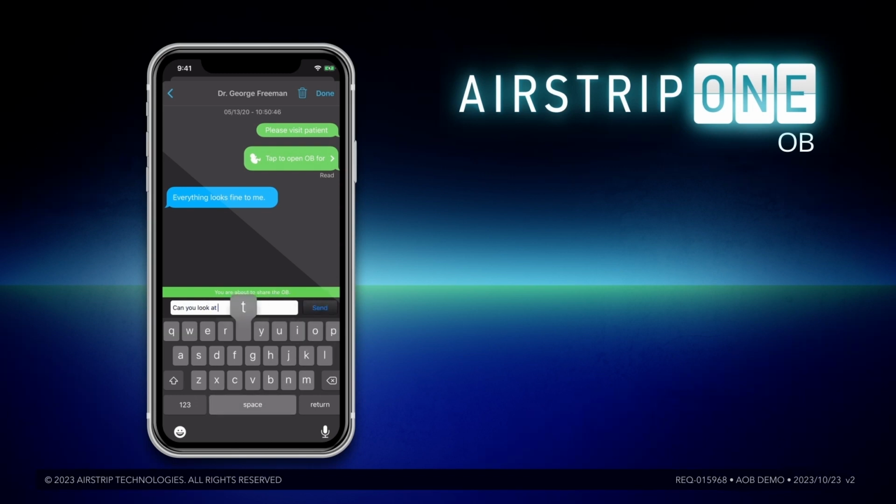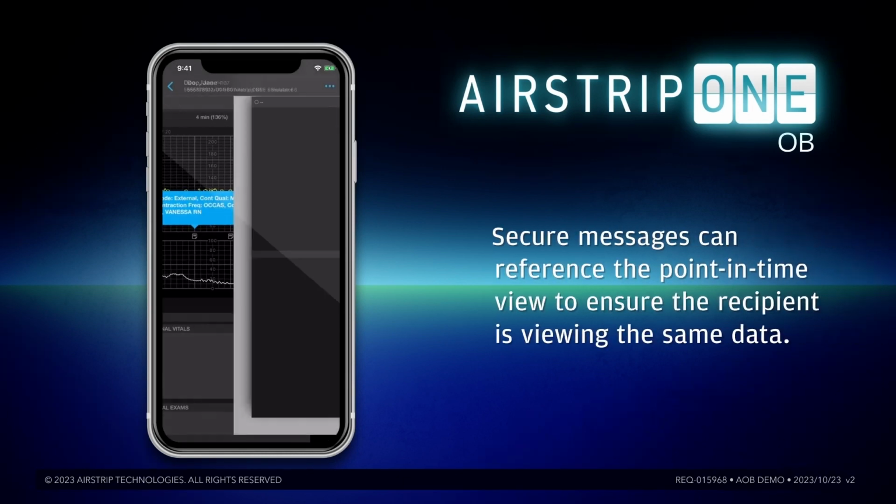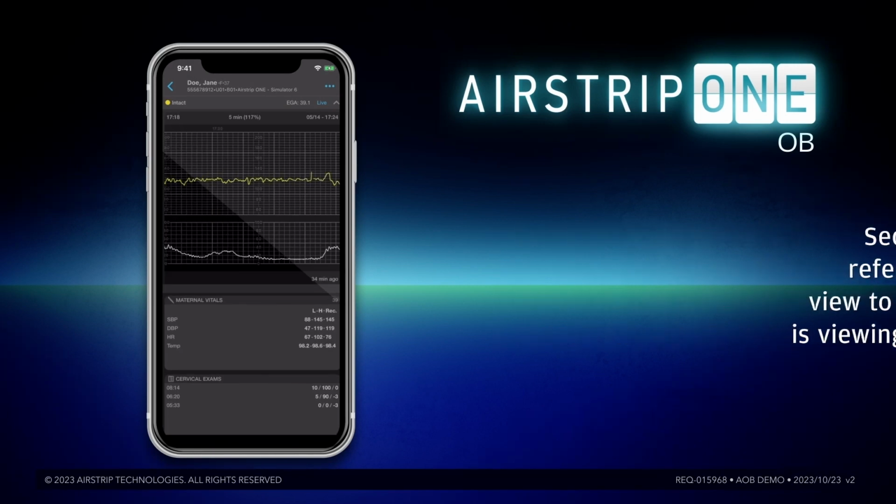The recipient will receive the link to the patient's strip, along with the typed message. Tapping the included link will take the user directly to the patient data that was being observed when the link was shared.